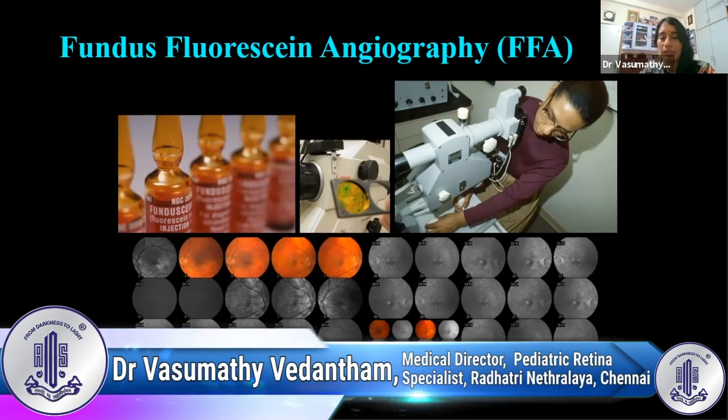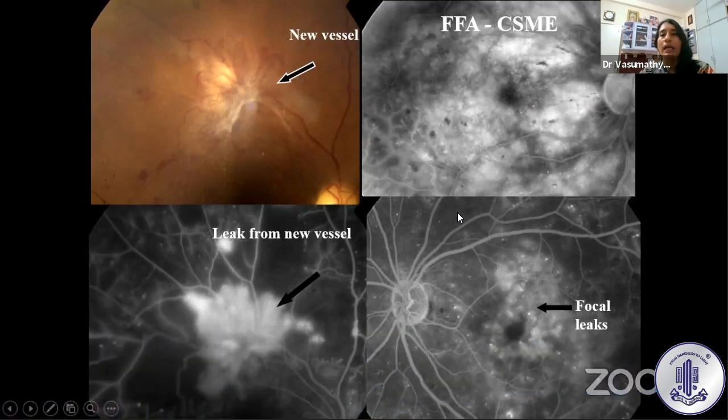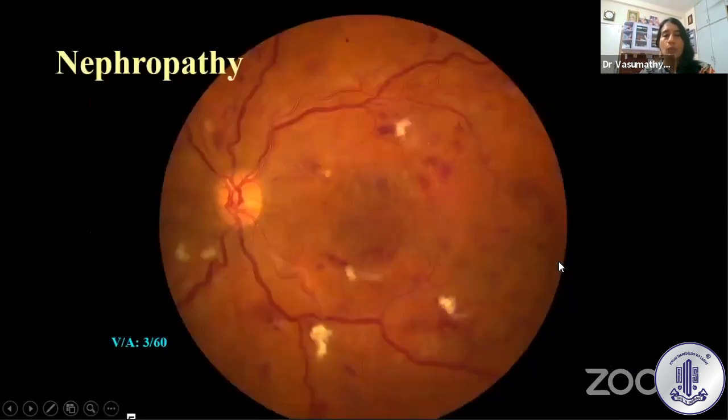The gold standard investigation, which has been there for dog's years, is fundus fluorescein angiography. It can beautifully image these new vessels as seen here with the adjacent capillary non-perfusion areas and a baby new vessel here. In clinically significant macular edema, the diffuse leakage can be made out as well as the focal points of leakage from the microaneurysms. So FFA has helped us retinologists in a lot of ways.